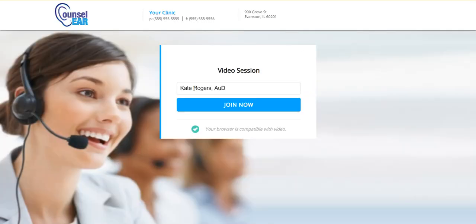So I'll click here. That will open up the telehealth session. This, of course, would have your logo and your information. You type in your name, you click Join Now. This will launch the telehealth session. Now, typically, you would see the camera pop up here. It would show you your current image. So you could shift the camera, you could reposition, you could make sure that everything's ready in your background for this telehealth session. Unfortunately, because I'm recording, it's not allowing me to show that as well.